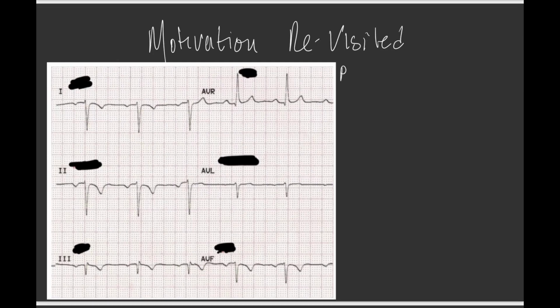So remember we said that pattern 1 was that everything on the left side should be positive, but we see that our P wave is inverted. We have an RS complex, which is predominantly negative, and our T waves are inverted. Again, we have an inverted P wave, a predominantly negative QRS complex, and inverted T waves in lead 2.